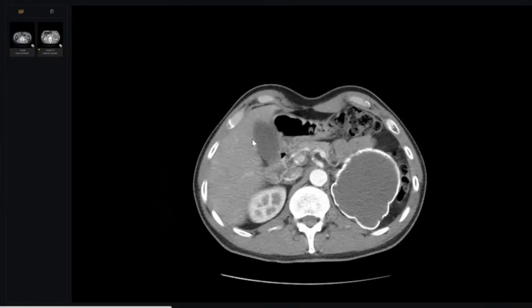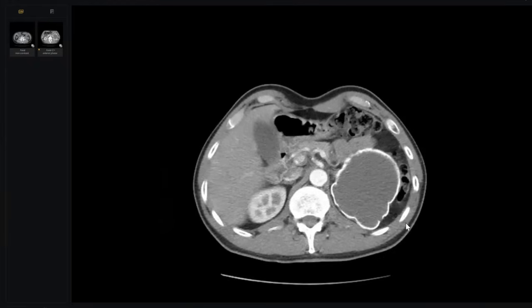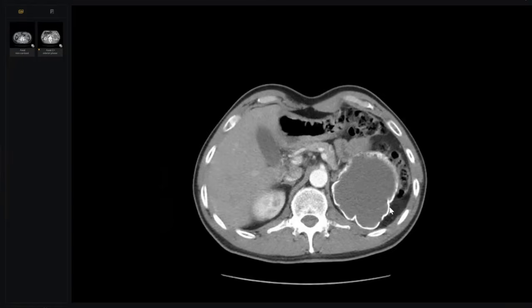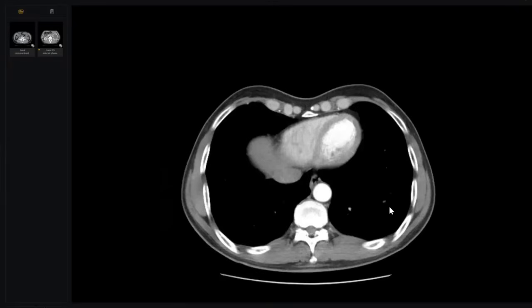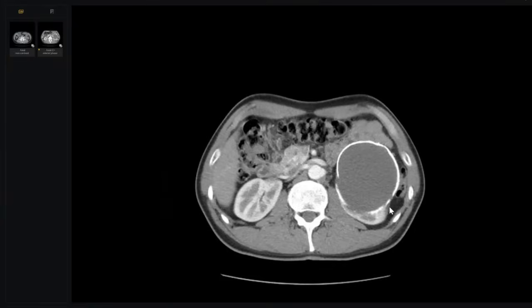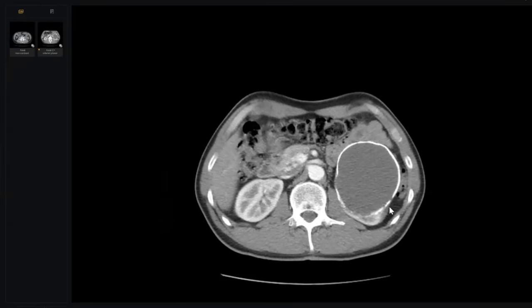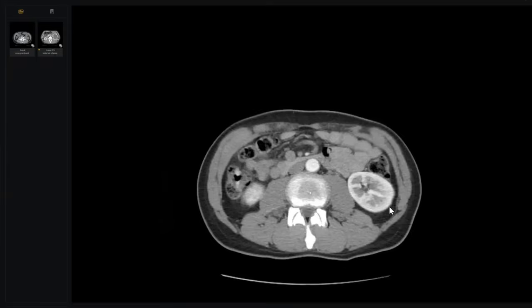I told all of you many times, when the examiner presents a very obvious lesion, don't trust him. There is something else hiding. Look here, what happened in the CT. You are looking and then you find a very large cystic peripheral calcified lesion. So it looks like a cyst. Then you must search for something more critical.